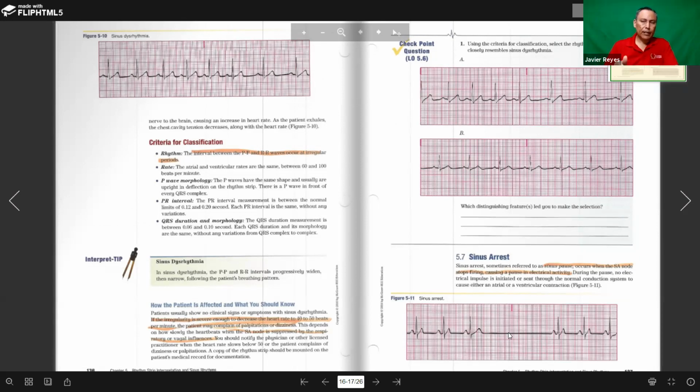We're going to see in the next chapter that your atrial cells have the ability to start to take over, and not just one, but the fastest heart rate will take over. We'll go into that later, okay? For right now, sinus arrest means there's a pause, a blank, zero electrical activity. This could be a serious problem, right? If it doesn't reset again, obviously you're dead.